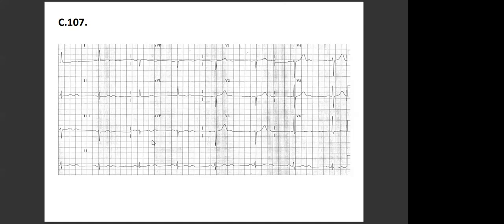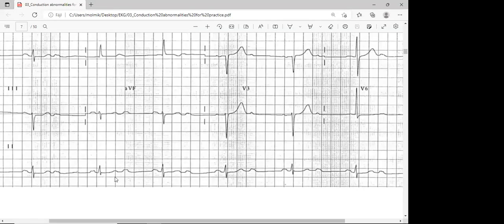And then I counted the beats per minute being 50. Yes, very slow. And so if it's not an AV block, then yes, that's an AV block. Look, I magnify it a little bit. Again, we have twice as many P waves as conducted. This is not conducted, conducted, not conducted, conducted, not conducted, conducted, not conducted, conducted. Again, we have a 2 to 1 AV block.